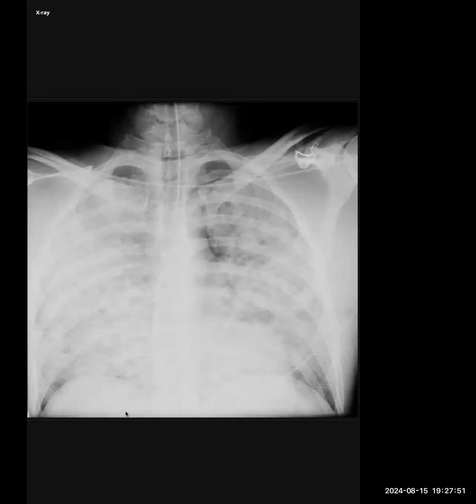I am presented with a frontal chest radiograph of a skeletally mature adult. I can see there is an endotracheal tube in situ and it is in correct position. I see there is diffuse opacification involving both the lungs, but the CP angles appear clear. There is no evidence of pneumothorax. I'm just looking at the ribs. Grossly, the ribs look normal.